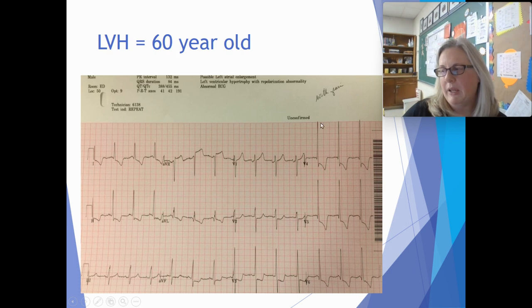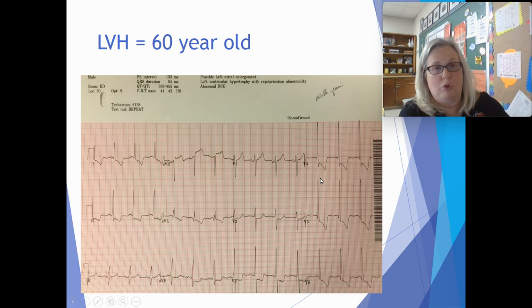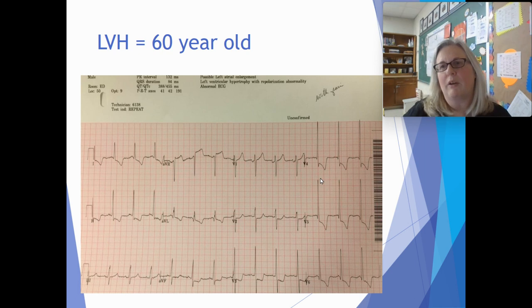So when we see big QRSs, specifically down near the left ventricle, which would be V4, 5, and 6, right? That's down in our armpit, kind of near the left ventricle. We see really big QRSs, and anything that happens inferiorly, then we know that they have LVH. And again, in a 60-year-old, it's typically caused by chronic hypertension that was not treated. Okay. All right.